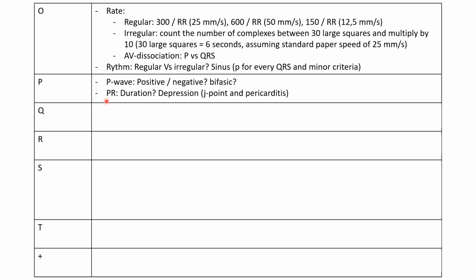All right. Then you have your P. Sorry, it's very rare that you only find this finding and nothing else. I think it's almost redundant sometimes, but it's mentioned in the books. So if I skip anything, that's one of the things I usually skip.